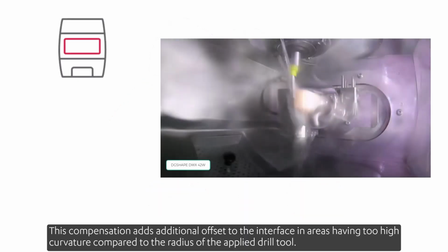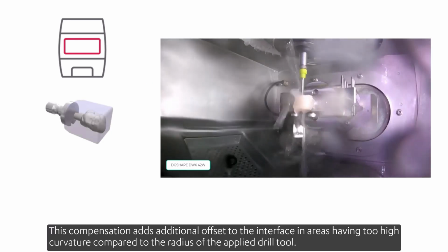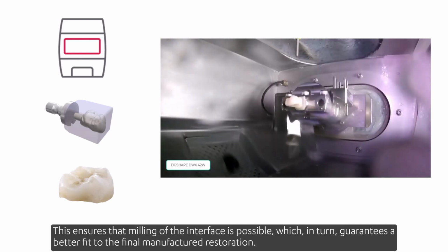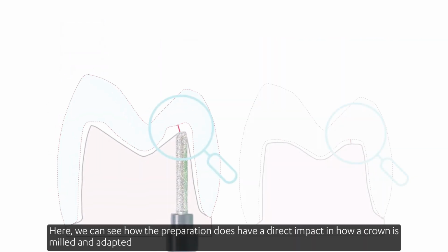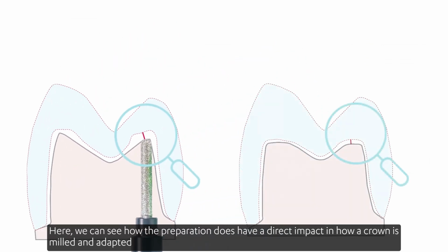This compensation adds additional offset to the interface in areas having too high curvatures compared to the radius of the applied drill tool. This ensures that the milling of the interface is possible, which in turn guarantees a better fit to the final manufactured restoration. Here we can see how the preparation has a direct impact on how a crown is milled and adapted.